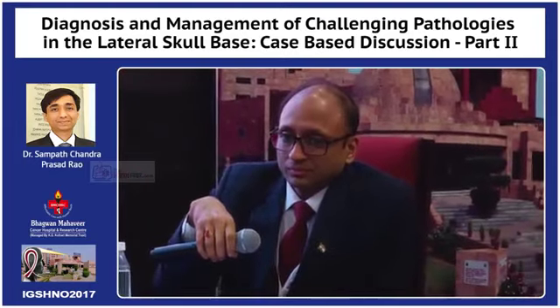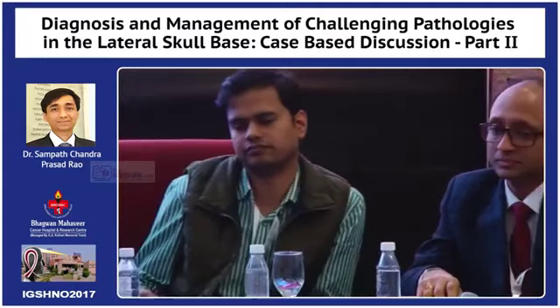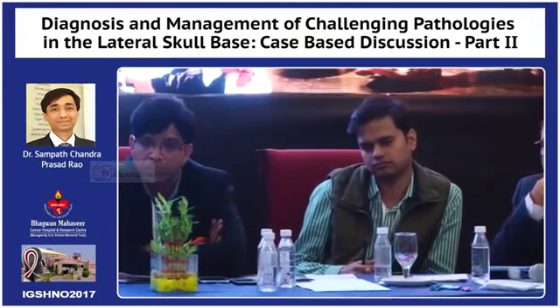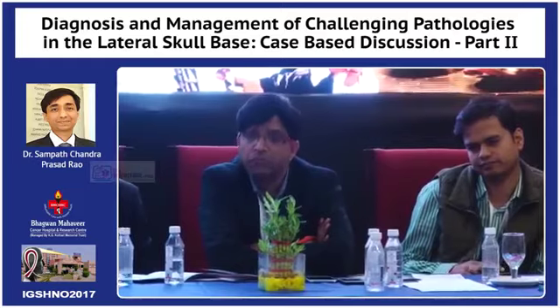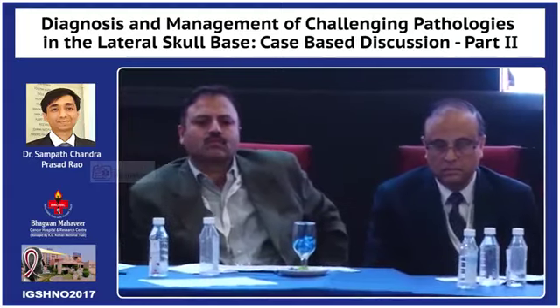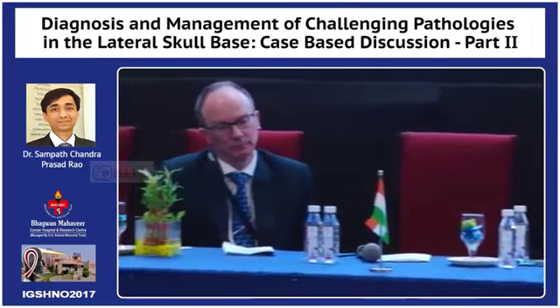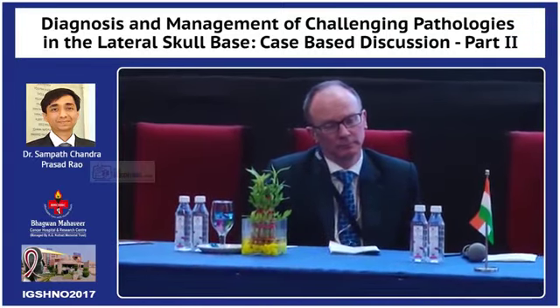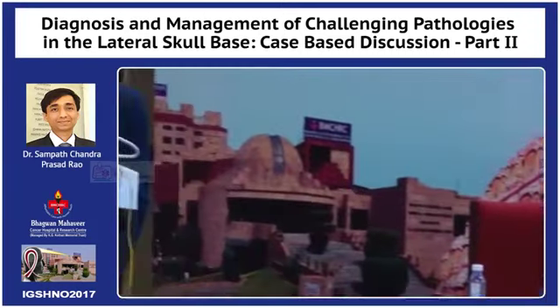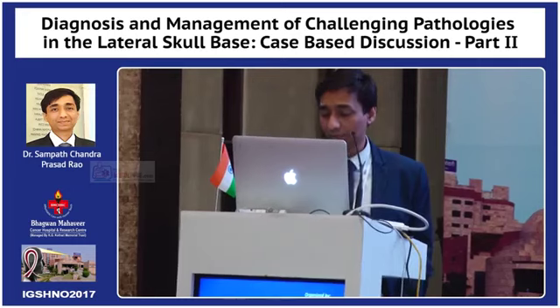To classify the tumor means that you have to study the pre-operative pictures very well. So unless you do that, you're not going to classify. You see here that the tumor is very much in contact with the posterior, with the cerebellum. And then, I'm sorry, let's go here. Also here, you see here? So that tumor is touching the brainstem and the cerebellum. And in this also you see, there is something there. And now we have to determine whether it's intradural or extradural.